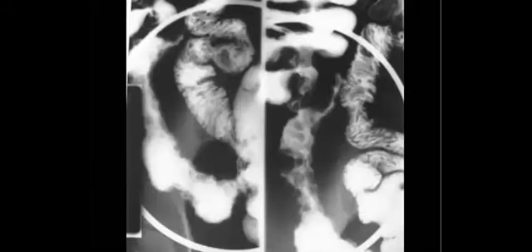They like to ask you something in Crohn's, especially if they show you the MRI, to know if it is active Crohn's or not. And from the CT or the barium, they like to ask you about the skip lesions, that you should trace and find another lesion if there are any skip lesions. In the CT, they will show you either the abscess, sinus, fistula, or something called creeping fat.